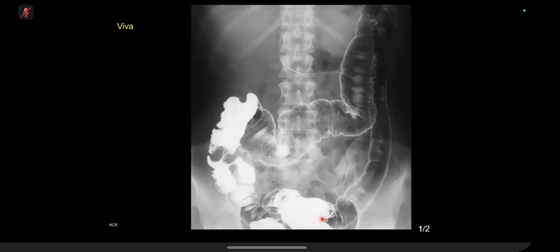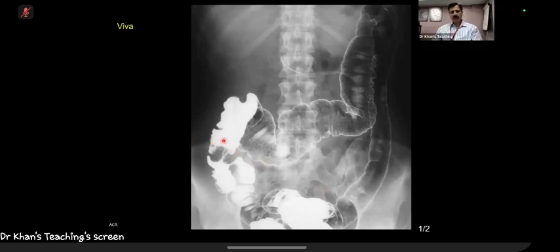So this shows there is a development of adenocarcinoma along with this. On a subsequent film it became absolutely normal. So this was a spasm which got clear. So I am not interested here. Can you tell me what is happening in the transverse colon, for example?